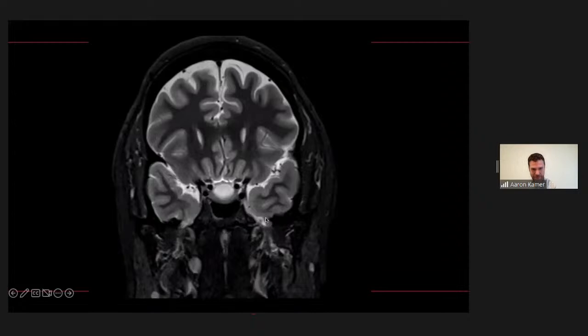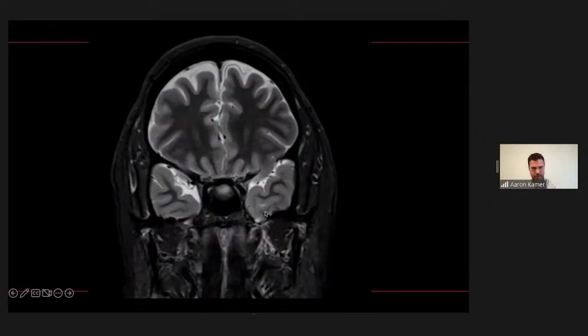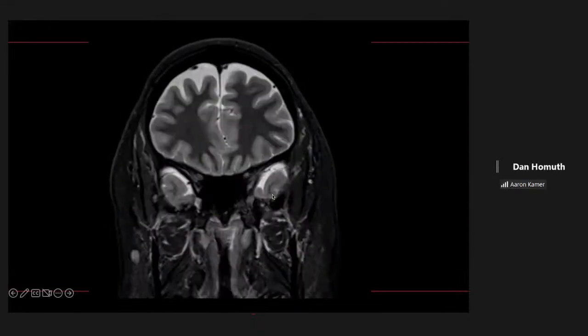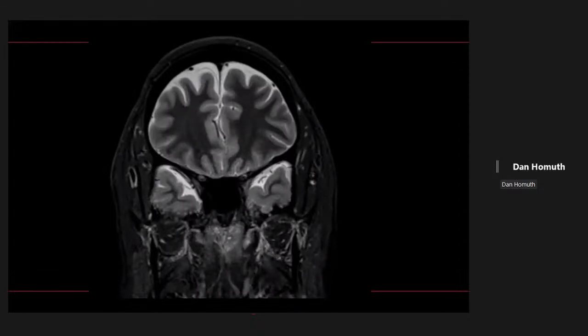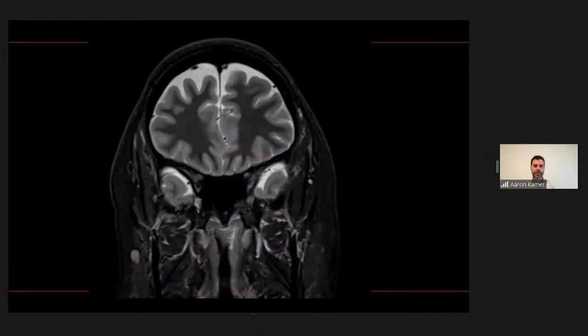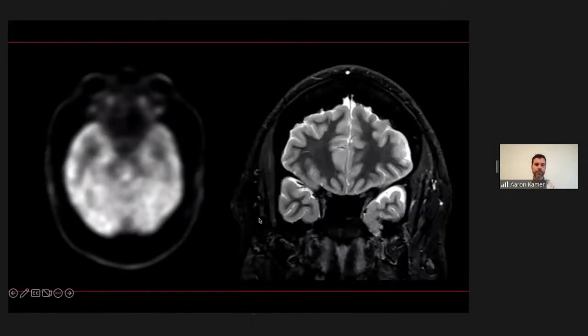I'm looking at there being a little brain parenchyma that comes down here. Yep. And then I'm also looking at all these little weird bubbly things, even a little brain parenchyma poking into one of these things. Okay. Yeah, it goes along with the intracranial hypertension now. So yeah, exactly. We're seeing a bunch of encephaloceles protruding through probably the tegmen. Yeah, like the greater wing of sphenoid, basically. Like poking into the anterior aspect of the middle cranial fossa. That's the place that I most commonly see them, into the greater wing of sphenoid.